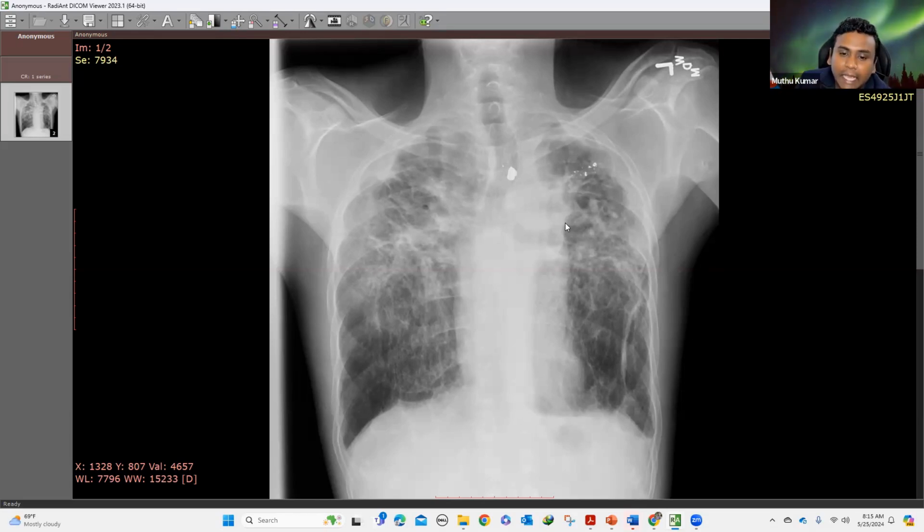But when you see an upper to mid lung predominant fibrosis with evidence of volume loss, the differential has to be, as you guys mentioned, TB, progressive massive fibrosis, other pneumoconiosis, radiation. Patients who have head and neck cancer and who underwent radiation treatment, that also needs to be considered. The other important thing which many people forget is ankylosing spondylitis, that can also cause upper lung predominant fibrosis. And the most important thing when you say mid to upper lung predominant fibrosis, sarcoid.